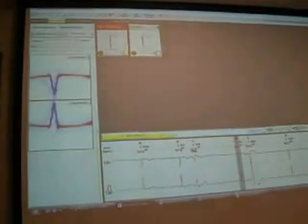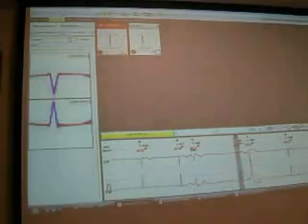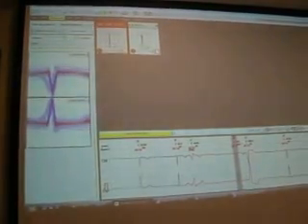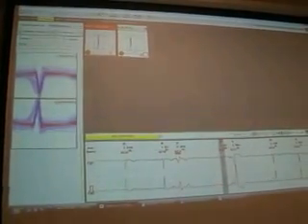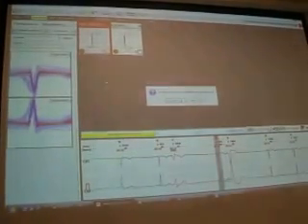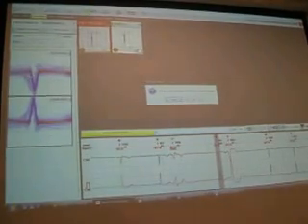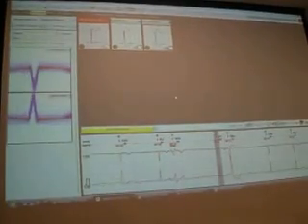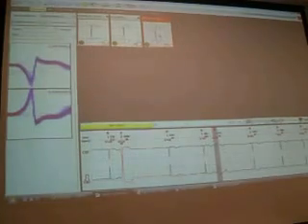What does it mean? There is a contrast function, and changing this contrast, you can see that here are those QRSs which are different from the main shape. I take them and I put them to another cluster.